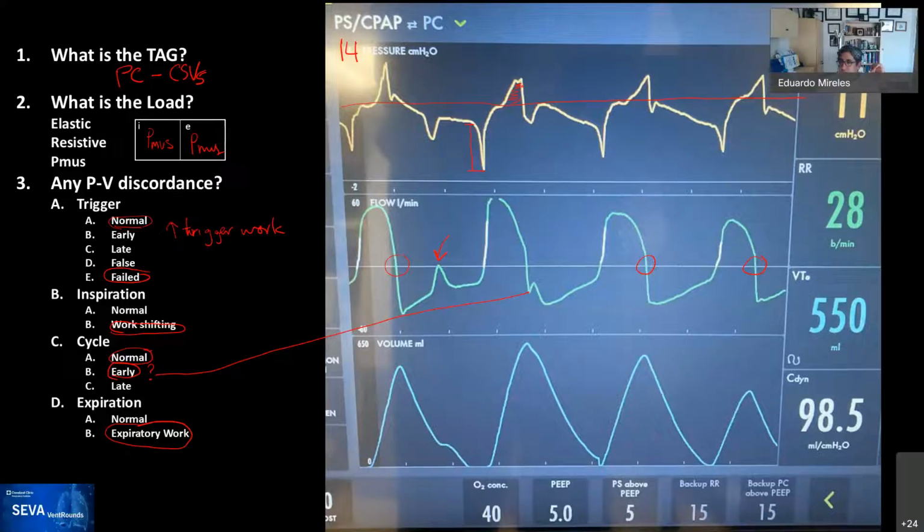I see a comment from Dilip. Is it Yunus editorial? Another artifact? Well, it's an artifact of pressurization. That's what the Yunus editorial talks about, Raman. It's not an active issue. It's just that the ventilator cannot maintain the pressurization, so you get the spike in pressure at the end of the breath.